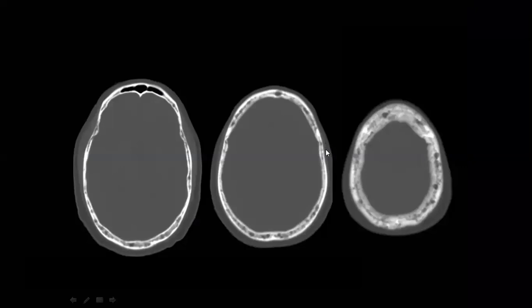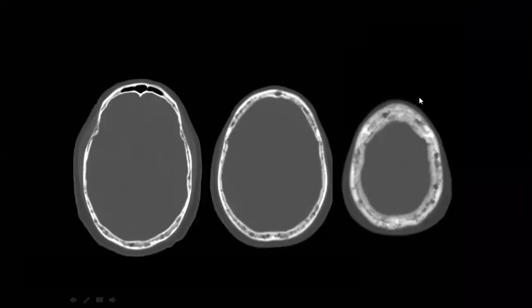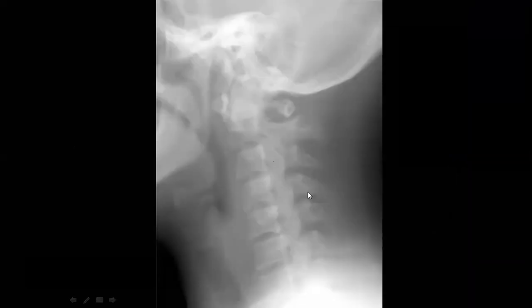Yes. So multiple lytic lesions. Again, put one of them multiple myeloma, especially if this patient is old, and they have osteopenia in the background. So don't forget to put this. Yes, mets also very nice, we mentioned it. But if it is multiple, epidermoid I think it will not be, but if single, both epidermoid cyst. Yeah. Again, X-ray spine.